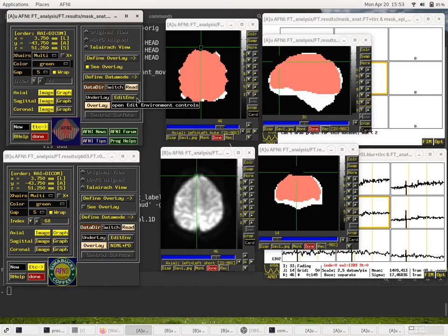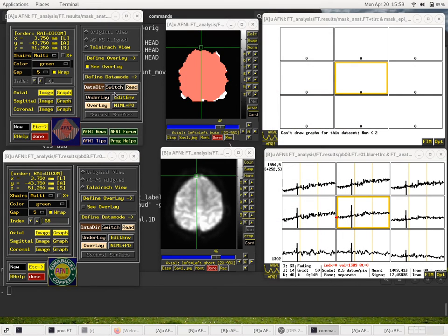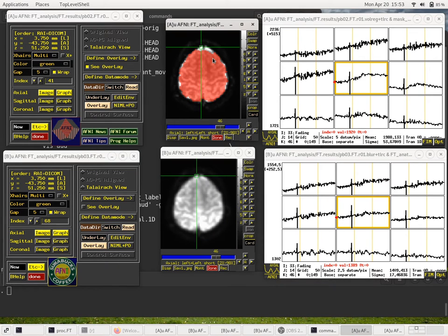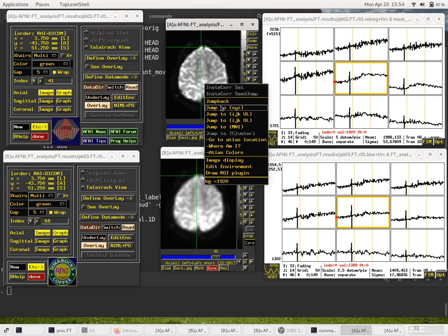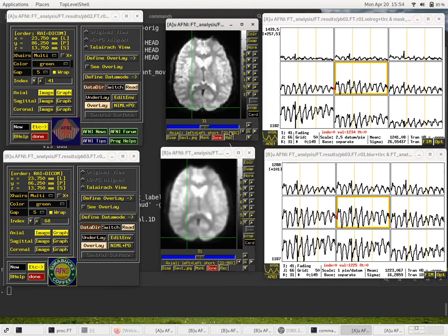Okay, so let's continue on with the processing now. I'm going to fix the windows on the top controller back. We were looking at the volreg results up there before, so I'll leap back to those and then I'll hit O to turn off the overlay, or I can toggle the button here, whichever. And then I'll jump back to our favorite coordinates from earlier. So jump right click and jump to XYZ, and still 248614 and set. So that's where we had been looking.